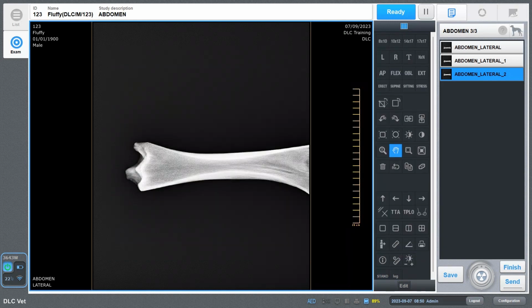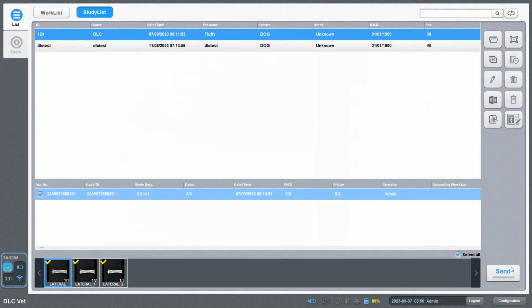These images will attach to the current study. So once again, only really recommended if you're doing it in the same study on the same day, or even the next day. Say 6 months down the track, I would recommend using the new study feature. When you finish, click on the finish button. It'll take you back to this screen. So we'll go button at a time.